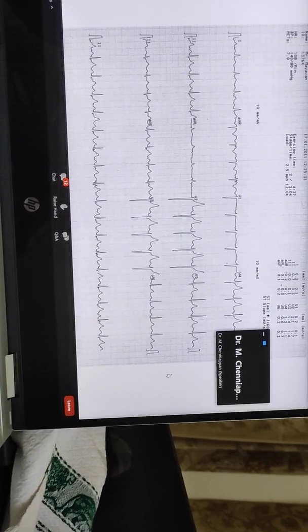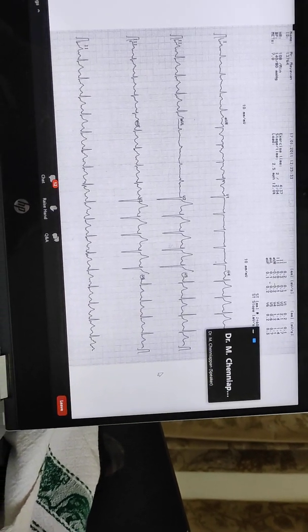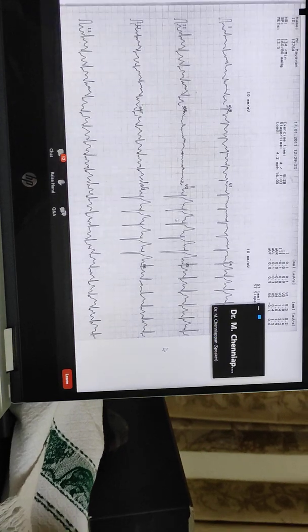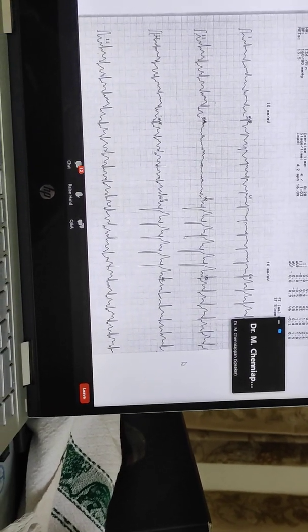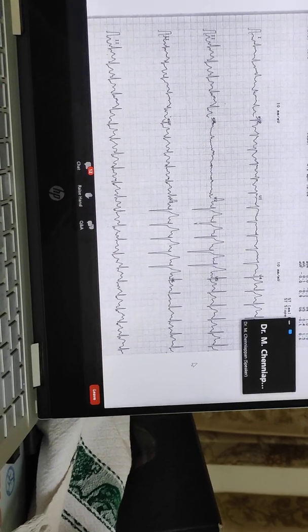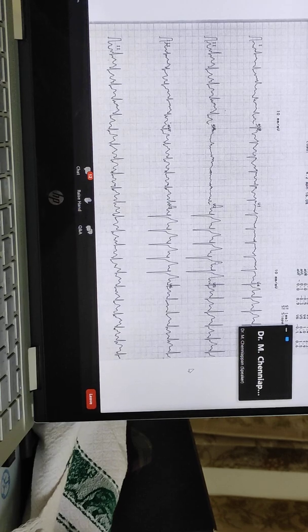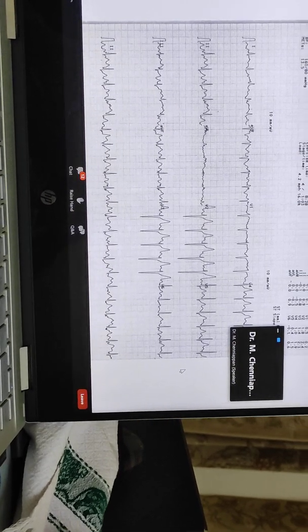Similarly, when you have a fast supraventricular arrhythmia, your accessory pathway may not conduct the impulses to the ventricles. That is an important clue: whenever, at the initiation of the tachycardia itself, I have disappearance of the delta wave and short PR, I have a long refractory period of the accessory pathway.